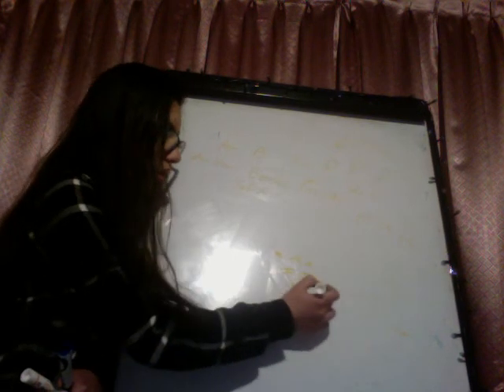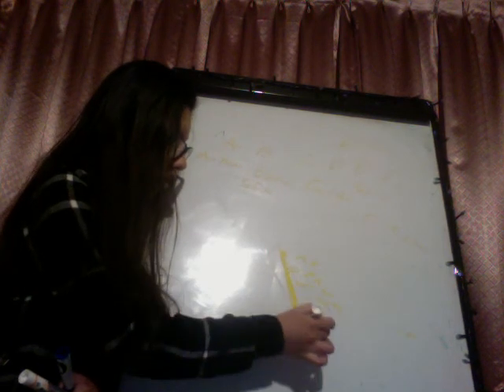Next we have the pulmonary artery in the left, and between we have the aortopulmonary window. Next we have the auricle, and next the ventricle. I think that I did this prominence very markedly. And here will be the descending aorta.